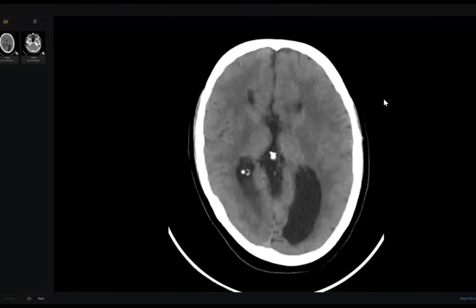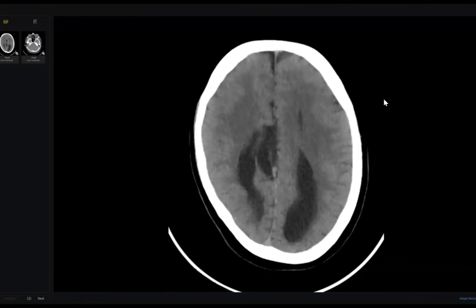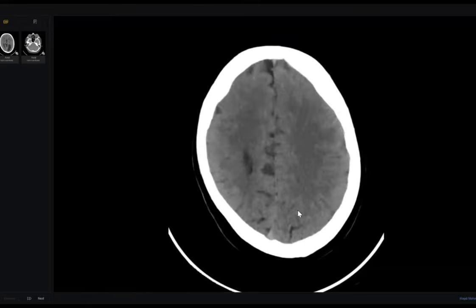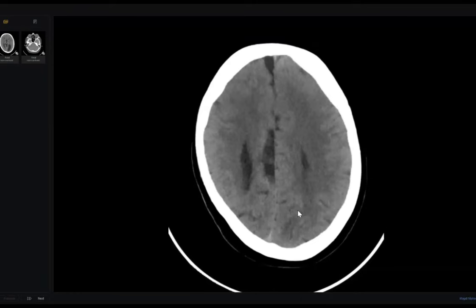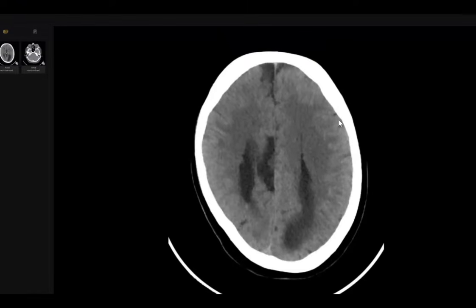I don't know. Let's recap what you said before. You talk about bilateral colpocephaly. Yeah, I'm thinking about idiopathic. Mute yourself, please, my colleagues.